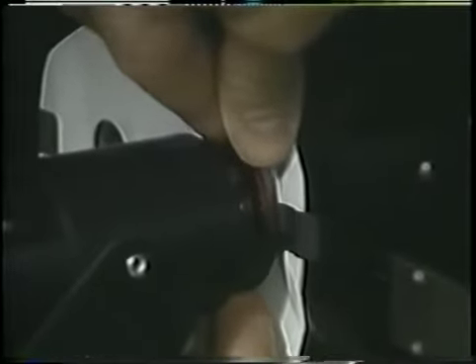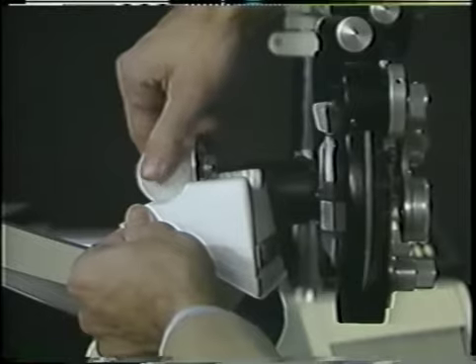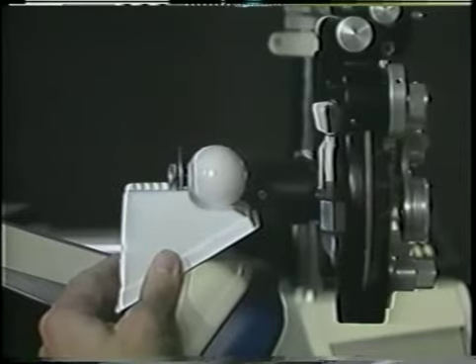Astigmatism can be added to the schematic eye with a cylindrical trial lens, and this will be done to create unknown refractive errors for practice purposes later. This Copeland-Reineck schematic eye from Benson Optical Company can be used if it's first rotated 180 degrees, with cylindrical lenses being taped on the back of the phoropter.